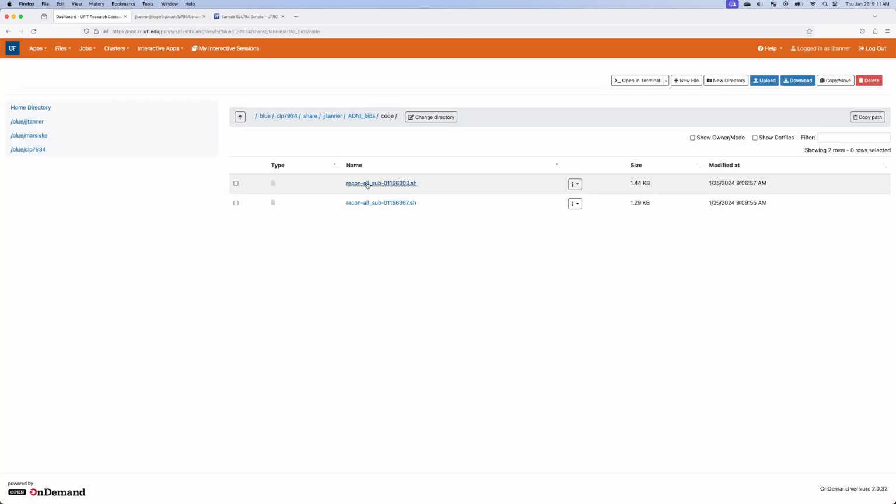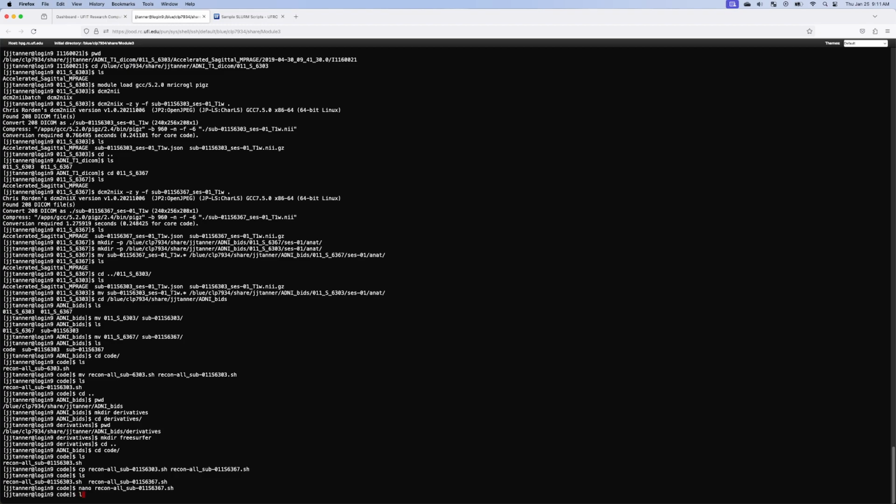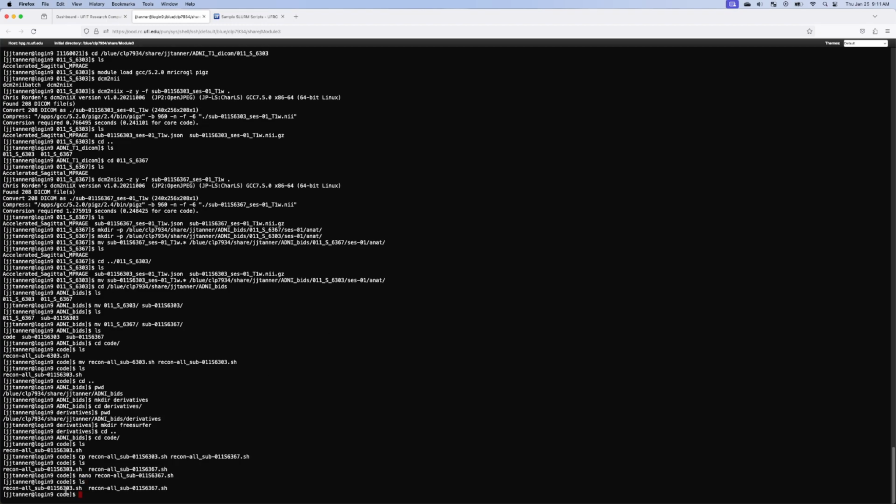And so this is the one that I'm going to actually submit. So how do we submit it? We submit it like this. Okay, so I'm in code, and we have the 6303, but remember that 6303 for me has both participants in it. So actually this 6367 I'm not going to use at all, so I'm going to delete it.